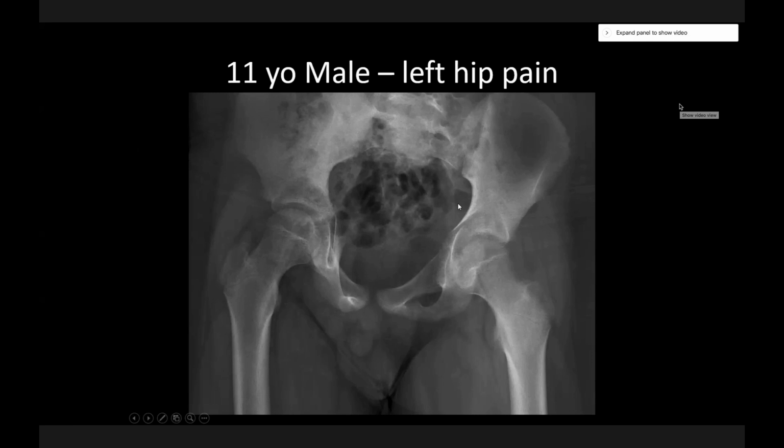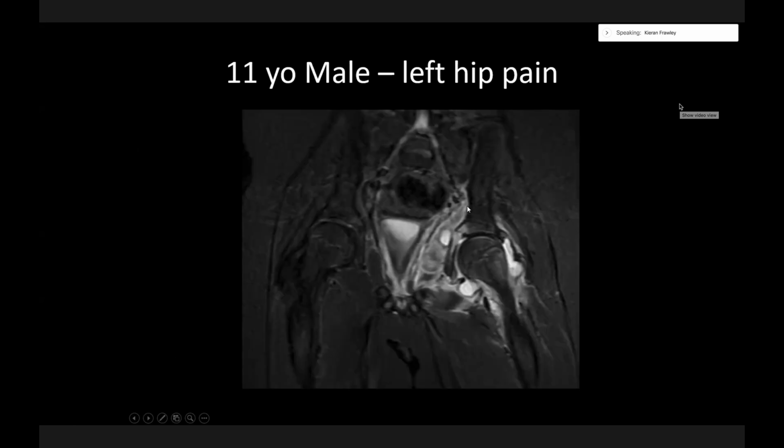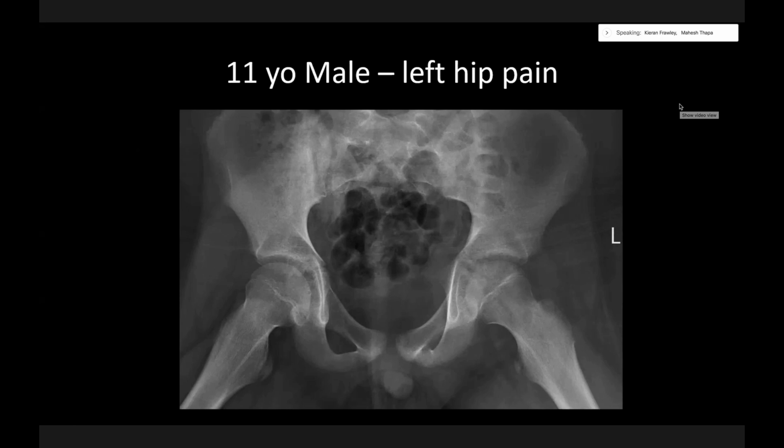The obturator fat pad is thickened on that side, particularly on this view compared to the other side. And there's the MRI. So basically, it's an osteomyelitis with an obturator internus abscess. Just going back to the residents, everyone knows about the psoas fat pad. You see thickening of the psoas, but here's the obturator internus. What was particularly disappointing for me for this case is I'd actually shown one of these at this meeting before. But at least I recommended the MRI, so no harm done.